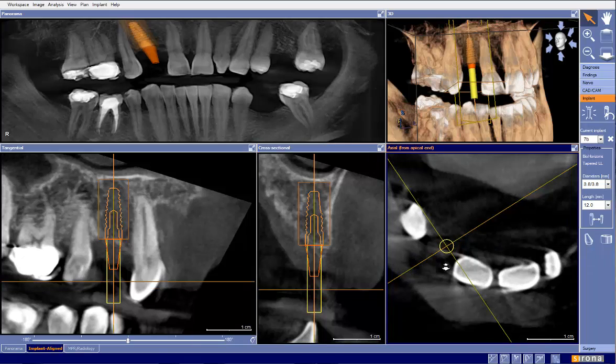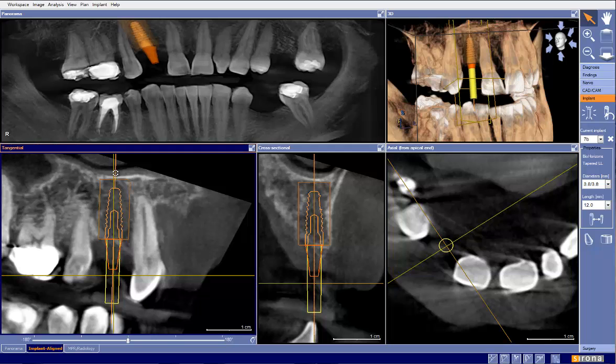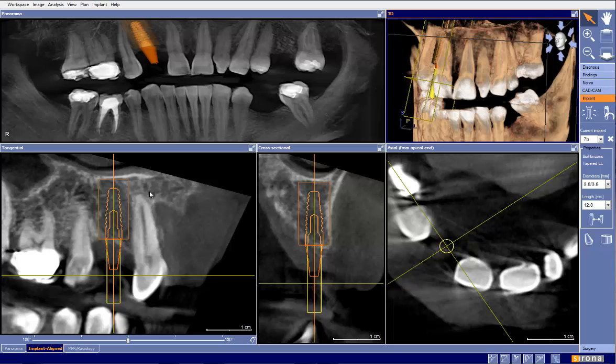And then the last thing from this view here is we can see that we have more space right here than we do right here. So we would probably go ahead and just tilt this implant a little bit to the middle there. Again, my bigger concern in this case aesthetically is how wide of a space that is to create a lateral incisor there, quote unquote lateral incisor. But other than that, and the slight movement to the lingual there, this plan was very well done, using a bigger implant. Thank you for your case submission, and hopefully you found this very helpful.